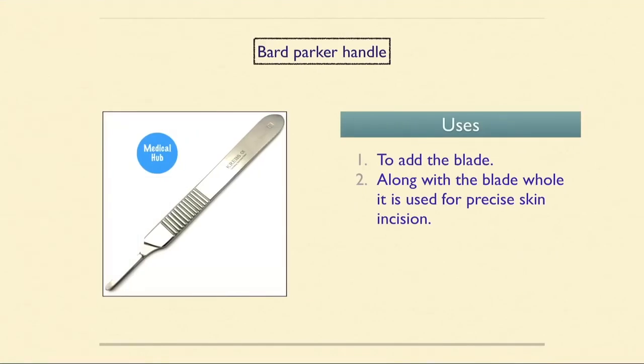Next instrument is the Bard-Parker handle. This is the handle and this is the blade. You can attach different blades to the handle. With the blade attached, the whole instrument is used for precise skin incision.